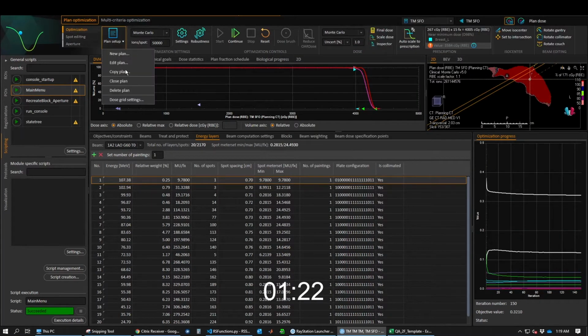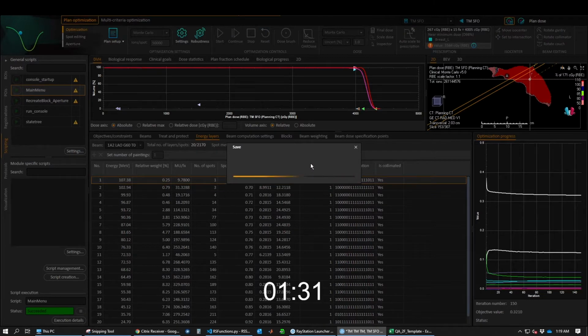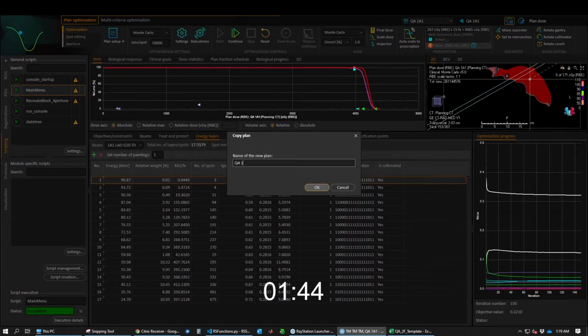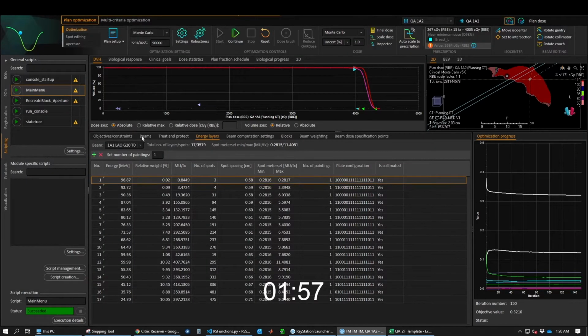After acquiring all the beam data, we're going to separate the beam sets, which may contain multiple individual beams, into several plans, each contains only one beam. This step is to bypass the limitation of one plan ISO in QA plans.